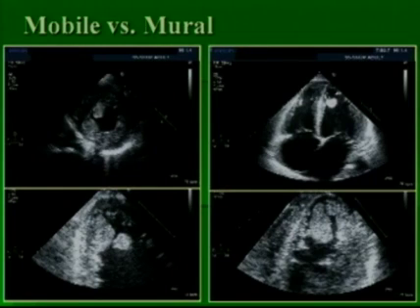But then right next to it, right in the middle of the left ventricular cavity near the apex there, is a ball-like structure which represents the pedunculated characteristic of another portion of this mass. And then on the upper right-hand corner, it's more easy to see the pedunculated aspect of it. And the lower right, you can also see the large nature of the mural thrombotic component.